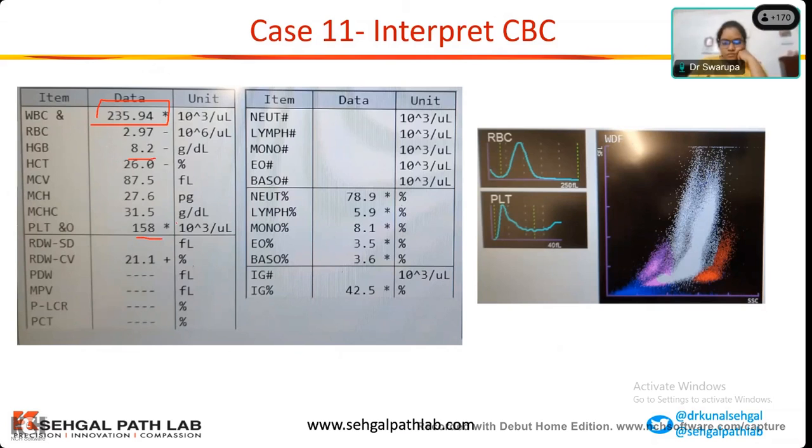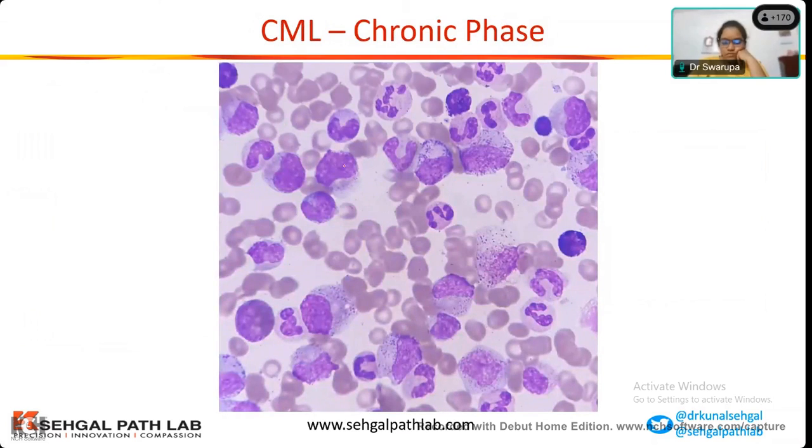Platelets are essentially normal. Leukocytosis is there, right? Yes, sir. So I'm going to go on to the smear. Can you tell me what is this cell? This cell, which I am pointing with an arrow. It's the neutrophils, sir. Okay, the hypersegmented neutrophils. Excellent. That is one. Neutrophils.